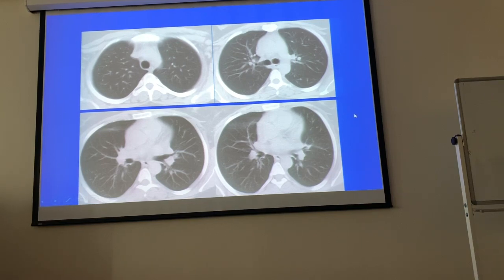Now which one is normal? Right. Who said all the four are normal? Yes, correct. All four are normal. I just want to show you that you are at the level of the trachea, so you are very high.